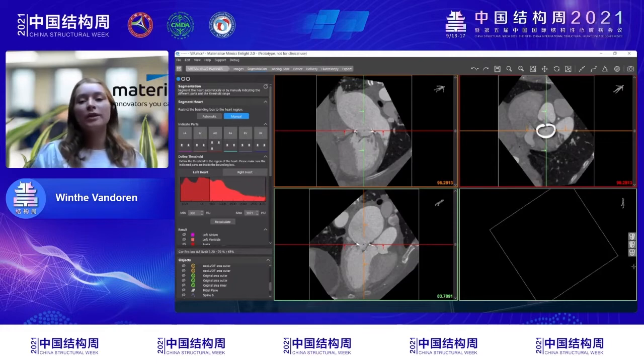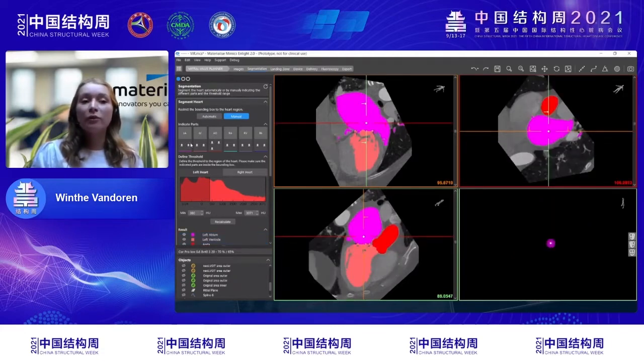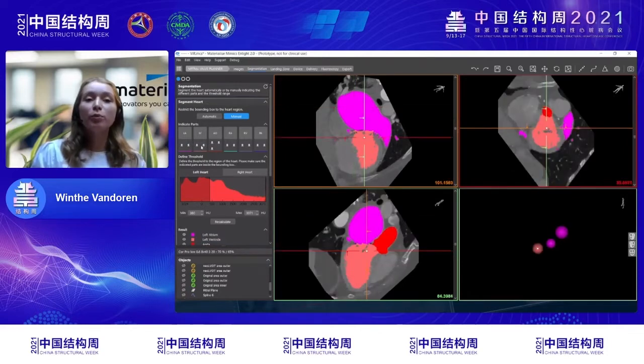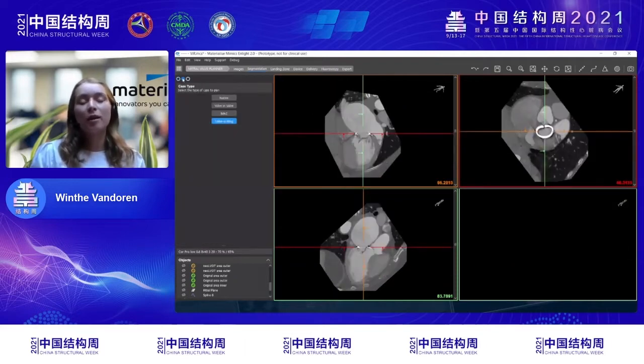But however, what I do want to give you away is what the principle is behind it. So either you have the automatic calculation with one click on the button, it starts calculating these masks, or you have the manual or semi-automated workflow. What does this mean? As a user, you will give 2 seed points for every anatomy as an input. So the only thing that you as a user need to input are 2 points for every anatomy. That being said, I'm going to go to the next step because indeed segmentation, it is preparing.